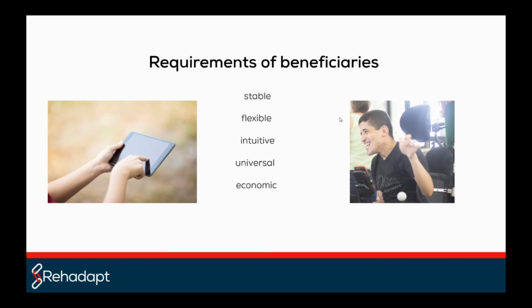So when you're having someone that starts at an early age and he's growing up and is changing from a typical standard wheelchair to a more active wheelchair, you can use the existing components, combine them with another frame clamp, and install the same mounting bracket also on another wheelchair with a couple of adjustments.